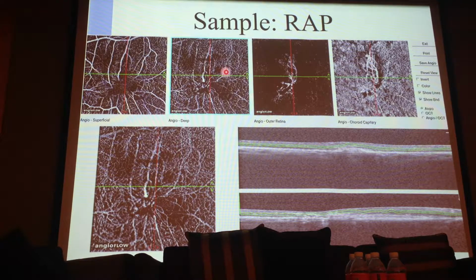These four segmentations, four layers, they are consecutive. So one layer adheres to each other. So we can get a 3-dimensional view of the information.